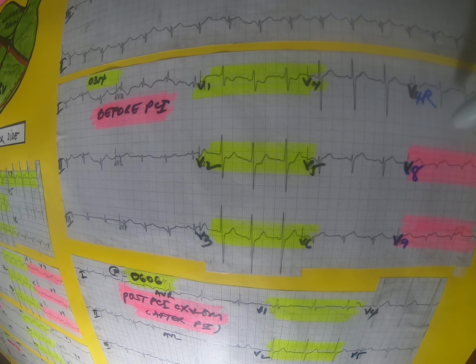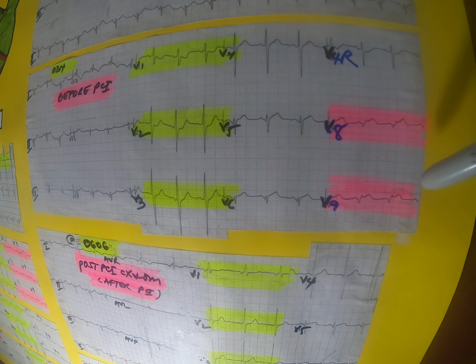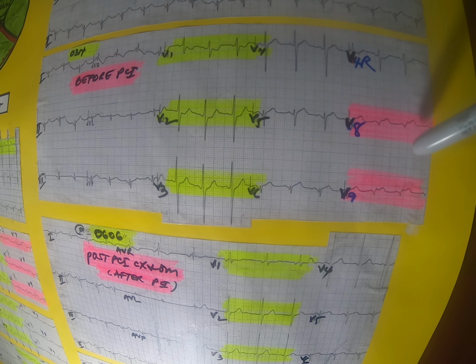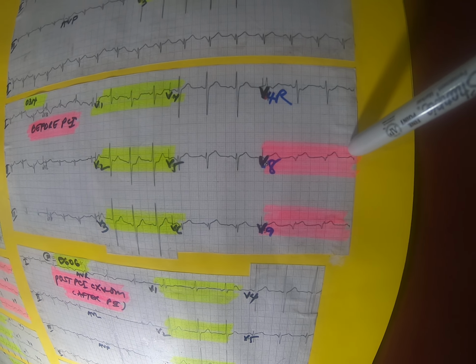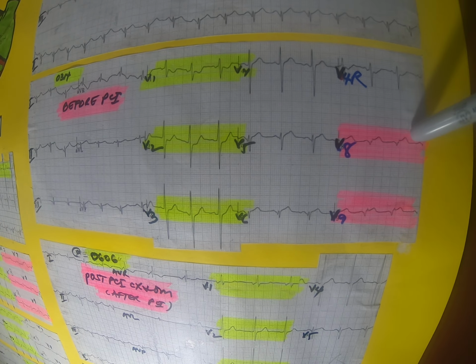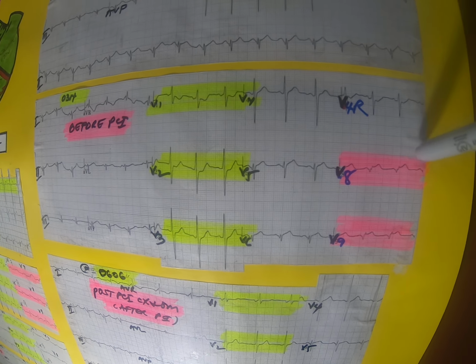And then they continued to check V8 and V9, and they remain elevated. These are the posterior leads. So it's still the same. It's confirming that we have a posterior STEMI, as I said, pending angiogram results.